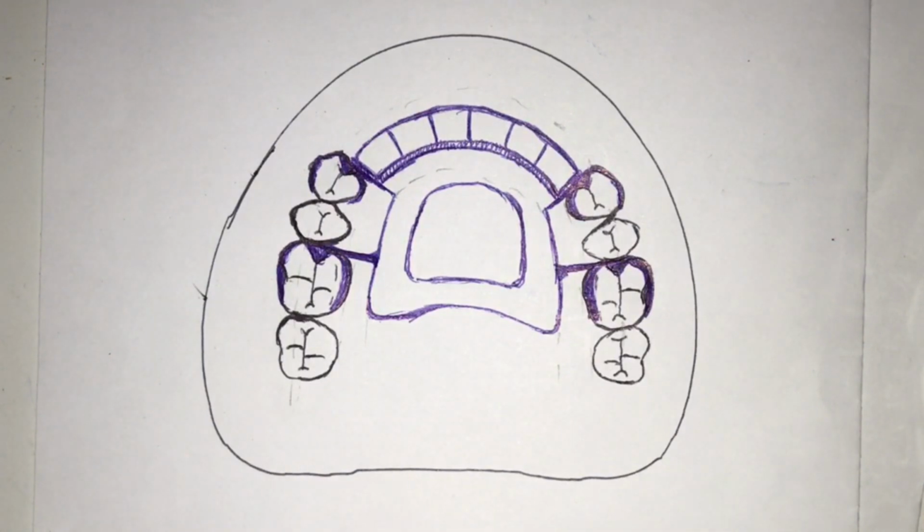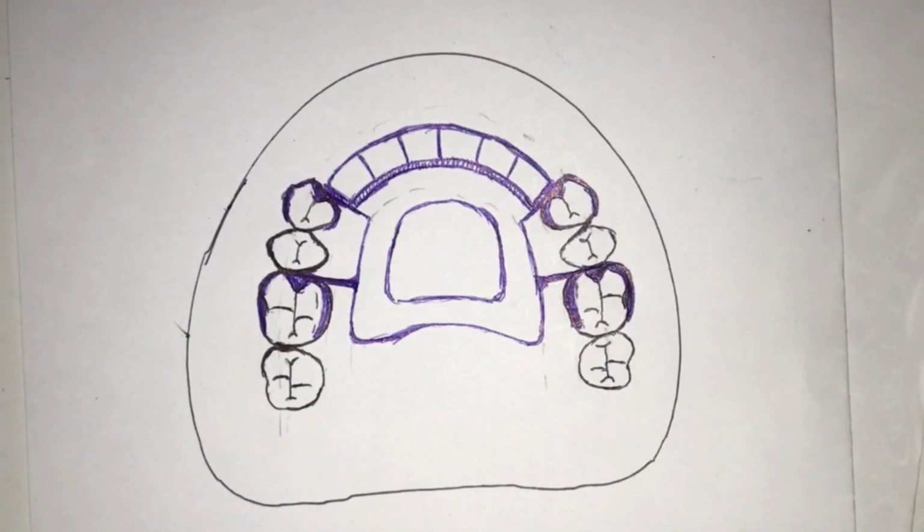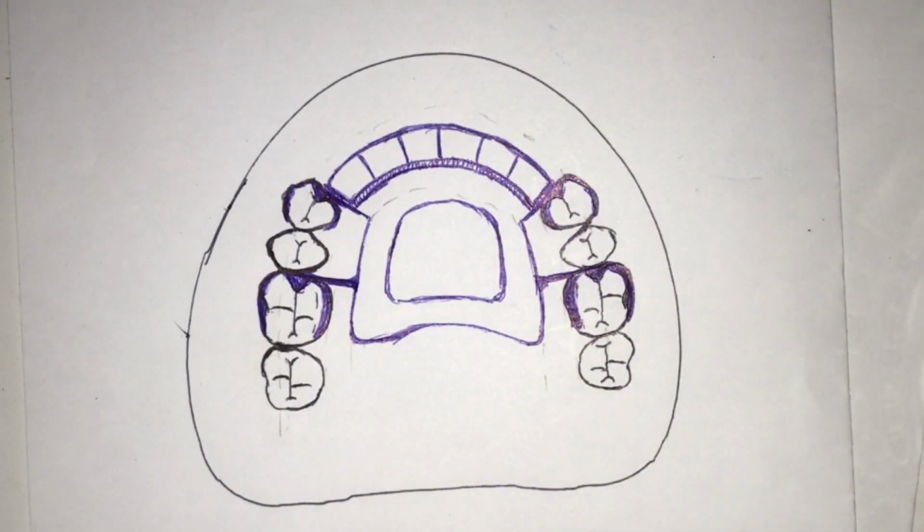So we are done with class 1, and then class 2, and then class 3. So we go to the last classification with the most basic design principle, and that is your class 4. And of course, following all of the steps, we have chosen our primary abutment tooth, placed our rests, and then our major connector, and then our minor connector, direct retainers.